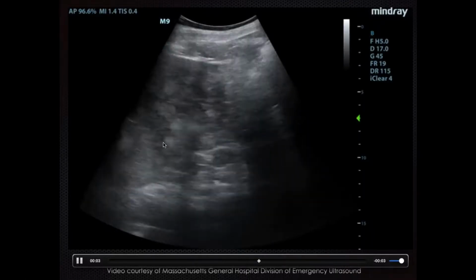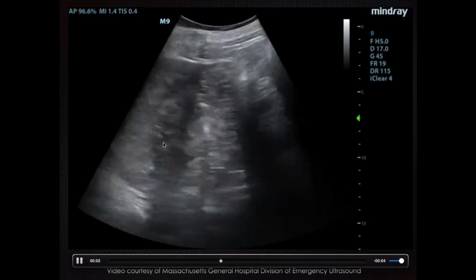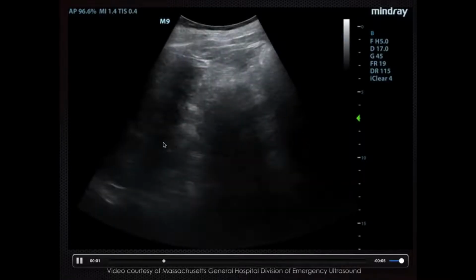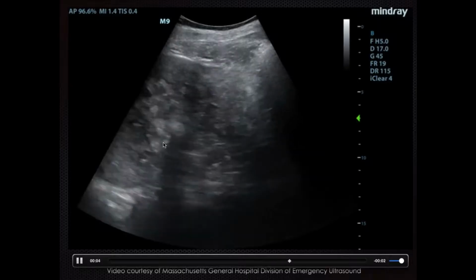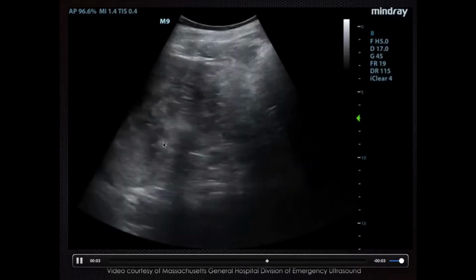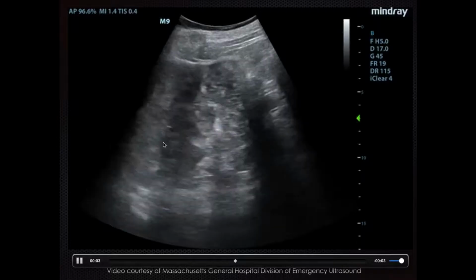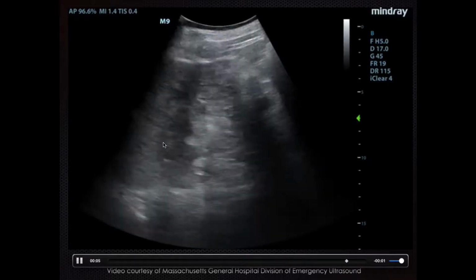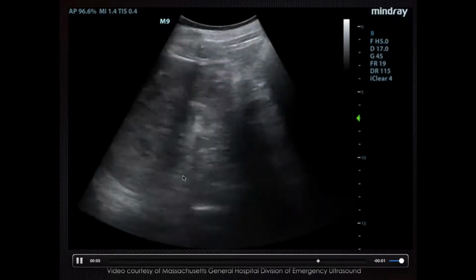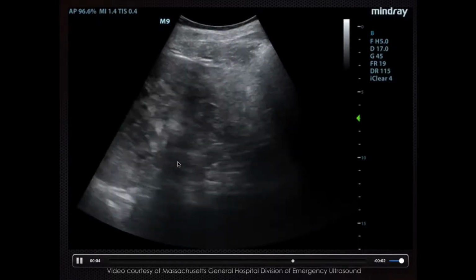Whenever I ask this question of my trainees, things related to splenic lesions, TB, and such would show up as possible answers. Now, the main teaching point I have for this video is that when you're evaluating the left upper quadrant, the first question I would ask of this clip is, where is the kidney? You don't want to jump to conclusions and start analyzing scans. Always go back to your landmark. I can't really see the kidney very convincingly in this clip.